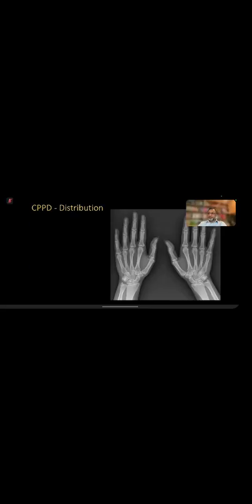Very good. It is osteoarthritis. Rajat Moore said that it is osteoarthritis, but osteoarthritis at unusual places. That's how we differentiate. It looks like osteoarthritis in unusual places, but associated with large subchondral cysts. We call them geodes. Geodes we can see in rheumatoid as well, but if you see a large cyst, we look for or think of geodes. So what is the distribution?